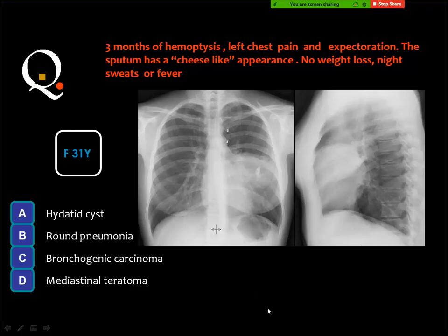No, and I have mentioned many times to the clinicians, do not look for any sentence mentioning atelectatic bands. It means nothing. It means an old scar in the lung. But we usually write it in the report to show that we have seen this particular lesion. It does not mean anything, and it's better to avoid writing atelectatic bands, especially in major events. A patient has a bronchogenic carcinoma, then you mention atelectatic bands as well.